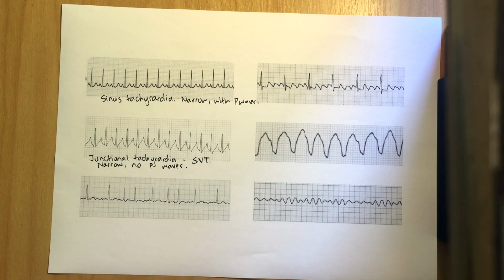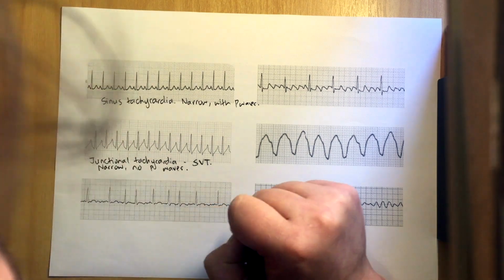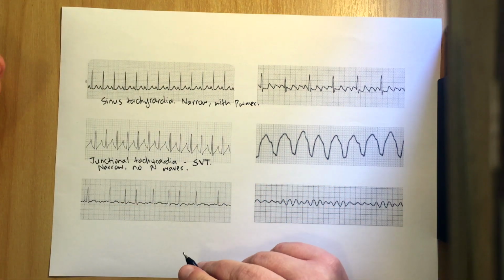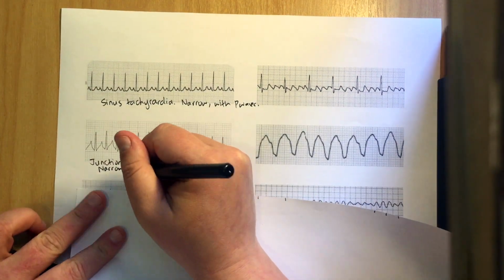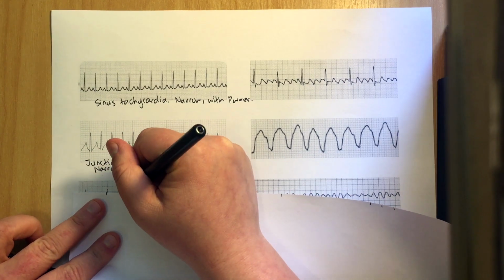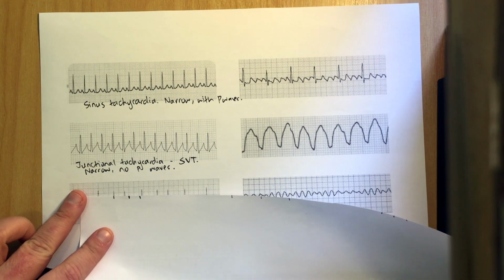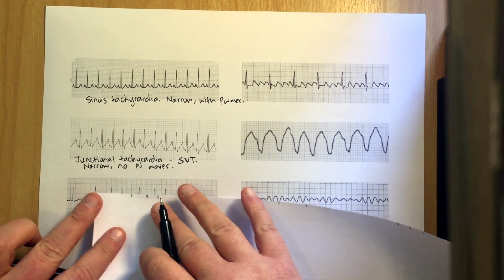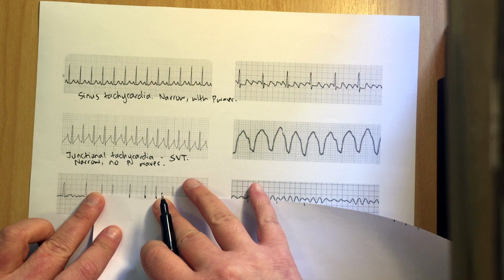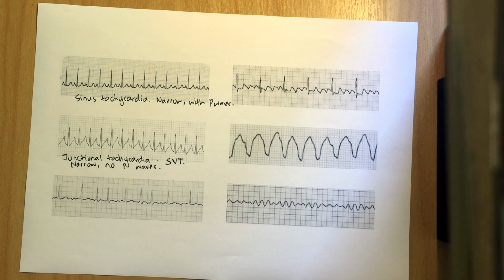All right, so this next rhythm, is it fast or slow? It's kind of variable, isn't it? So we'd need a full rhythm strip to count it. Is it regular or irregular? We can tell by eyeballing, but just to make the point of this being potentially useful, oh look, this clearly doesn't line up. Doesn't line up. It's lining up again there. Not lining up there. So this is irregular, and it's irregularly irregular.